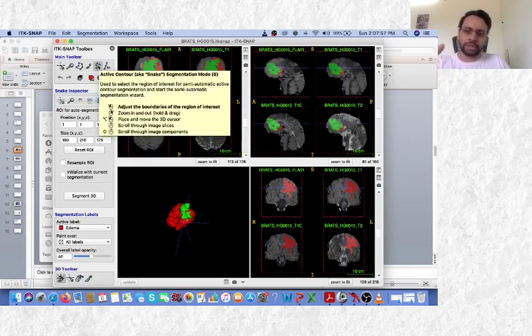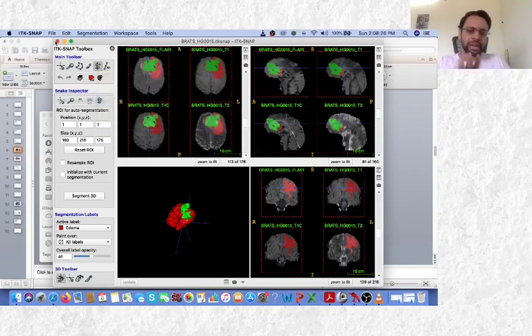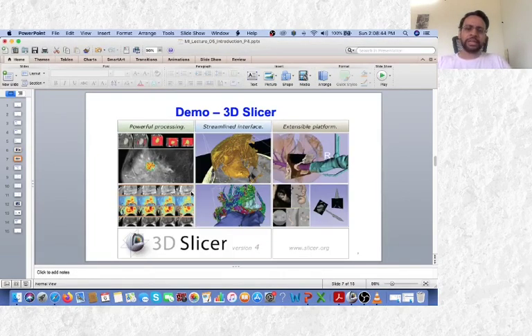Let us say something we would later discuss is active contour based methods. So it gives you a GUI based interface, and also it gives you a control for playing with the parameters, and it also allows you to give some seed points that serve as the starting point for the evolution of your segmentation results. So this is what ITK-SNAP is about. The objective here is just to introduce you to this tool, and you are expected to explore it in more detail. And after that, let me go to the demo for 3D slicer.